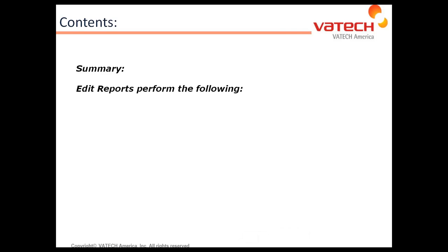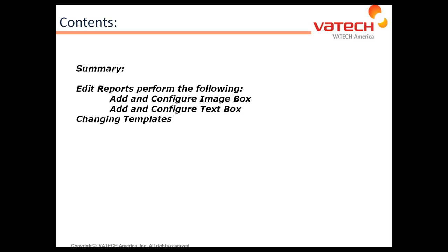In summary, you should now be able to edit reports to perform the following: add and configure an image box, add and configure a text box, changing templates.